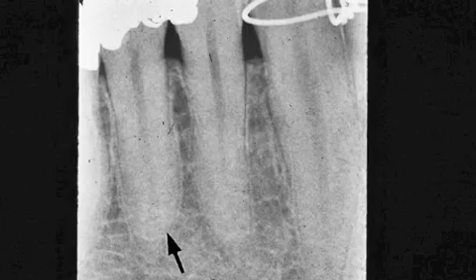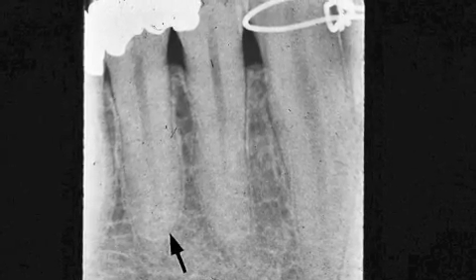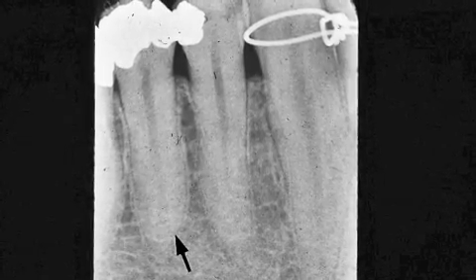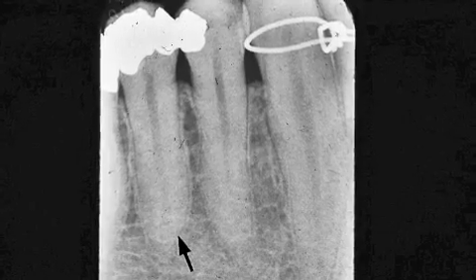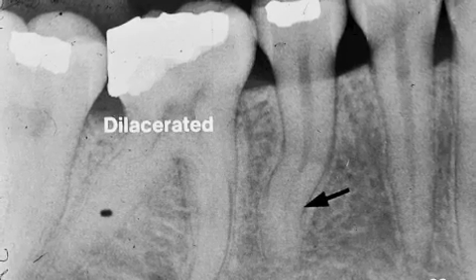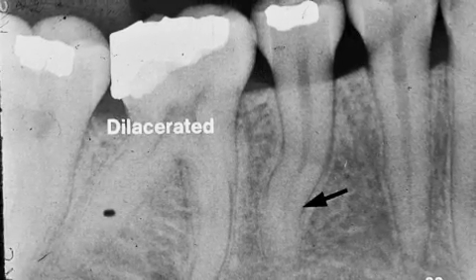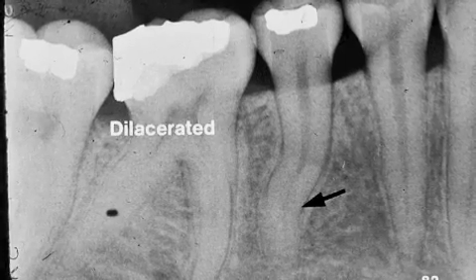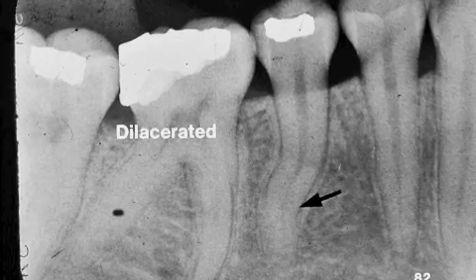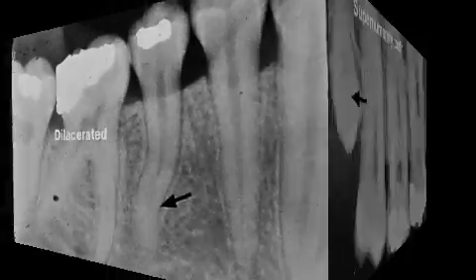The arrow pointing to tooth 29 shows a wider, fatter root surface, hypercementosis, due to additional cementum on the root. Tooth number 29, as the arrow points to, has a dilacerated or crooked root. Tooth number 30's distal root also appears crooked or dilacerated.